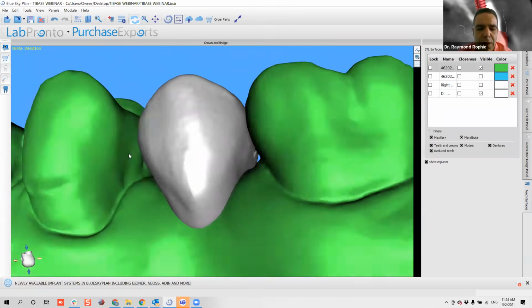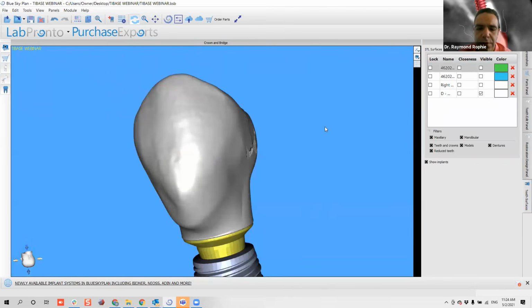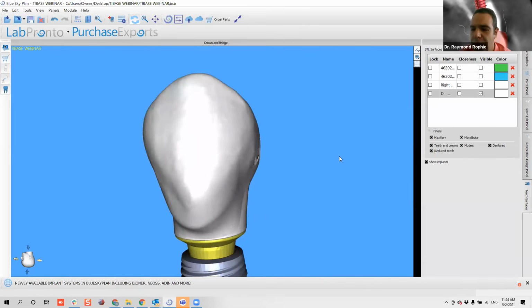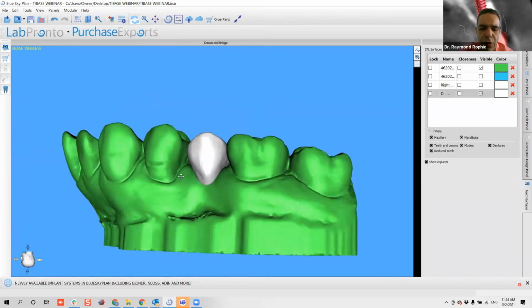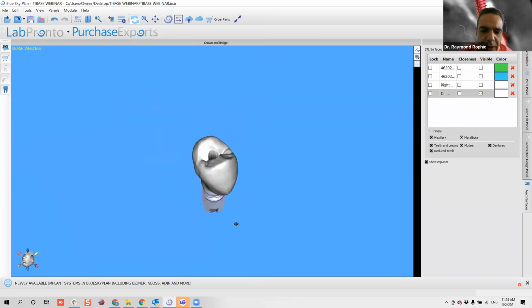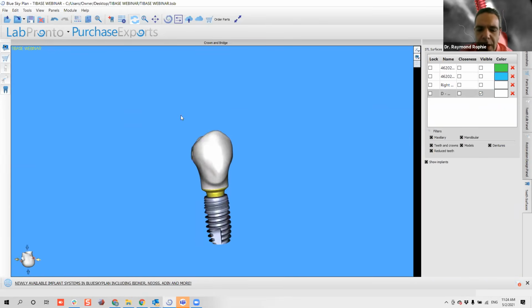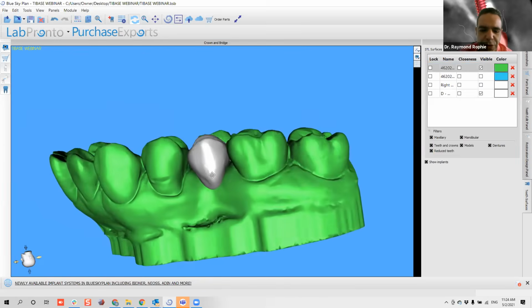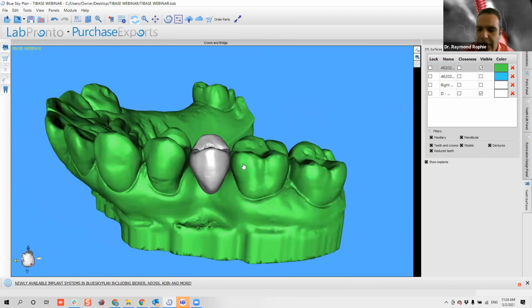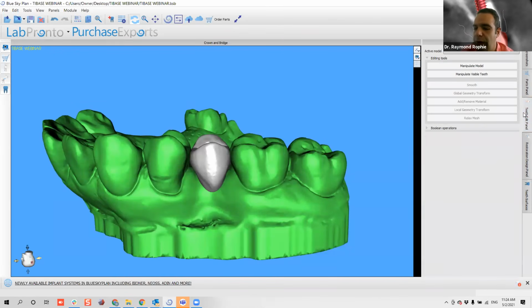Okay, so now we can go to the teeth surfaces and we'll have two different designs. Okay, we'll have one design that is my initial wax up and then your crown. Okay, so I do have now a crown that has a hole. It's a screw retained restoration. Okay, and now let's do the custom healing abutment. For the custom healing abutment, this will be really quick, really easy. You can just go here to the teeth edit panel.